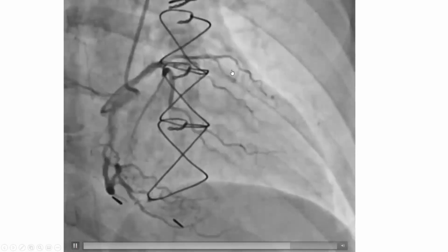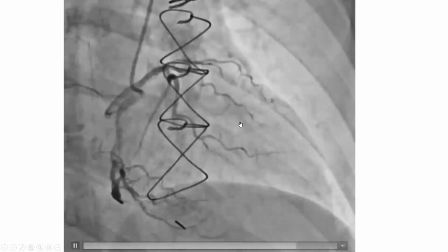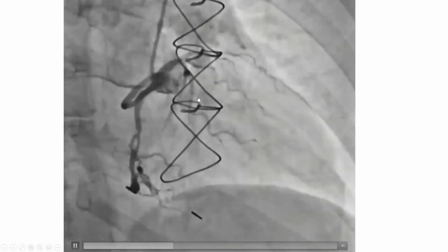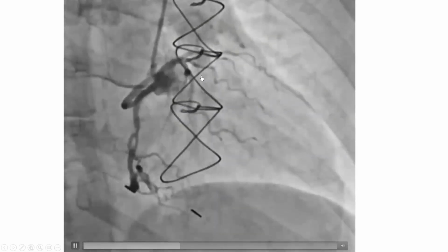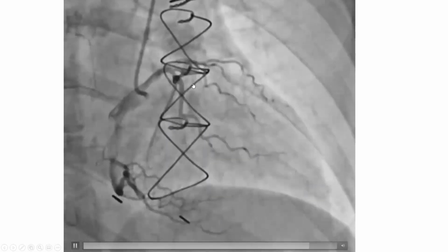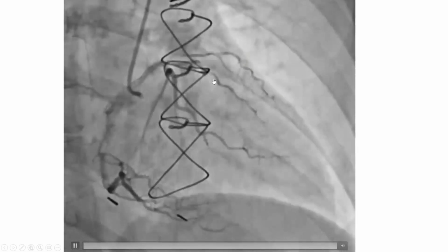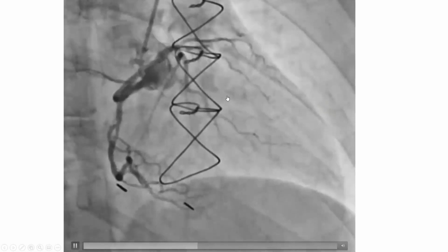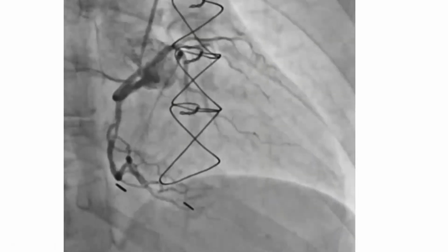And in the process, it gives those arteries. Now, are those just obtuse marginal branches, or is there an LAD with them? Again, in an RAO view, you don't just define the anomalous course, you can also define what are my arteries. Is this just left circumflex, or is it LAD and circumflex, or is it just LAD? Because like I said, the LAD and the left circumflex could have separate ostia.